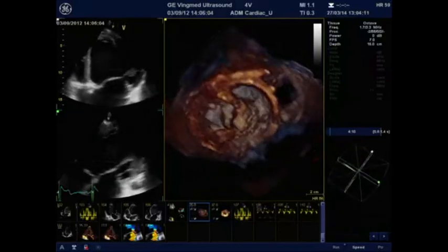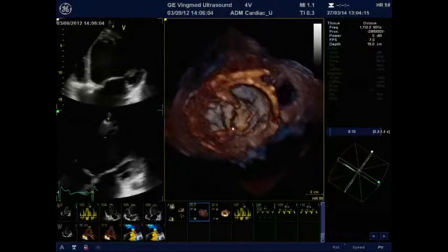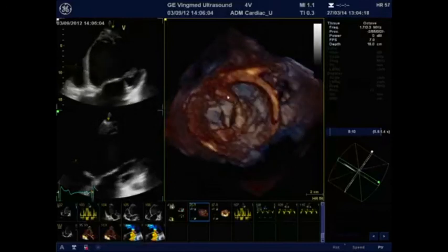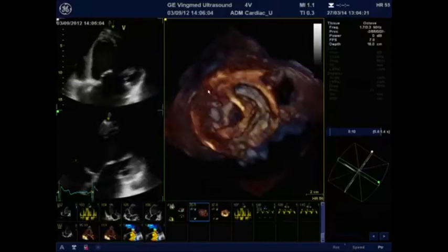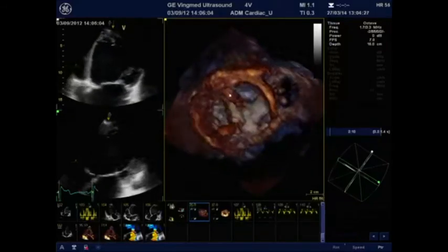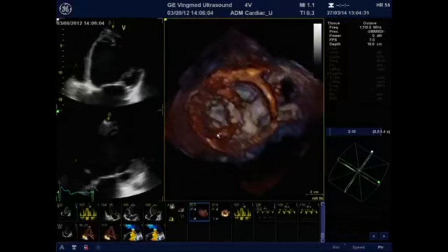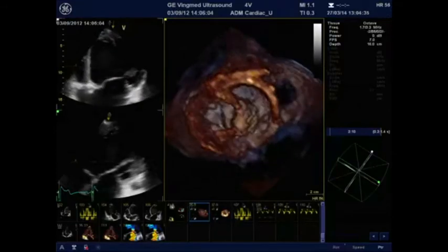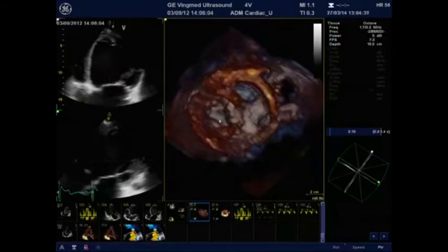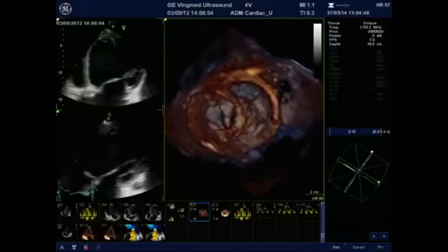This is the mitral valve, and you have a view from the left ventricle. And here you have the mitral orifice for sure, the mitral valve, the papillary muscle. You can perfectly underline the geometry of the left ventricle and the connection between the papillary muscle and the mitral leaflet. And if you look here, the axes of both papillary muscles are different because they are attracted apically and laterally due to the remodeling process secondary to the disease, and in these patients, again, it's a dilated cardiomyopathy.